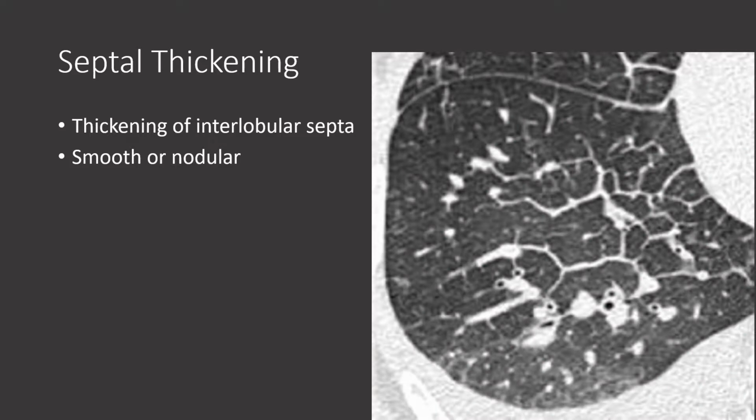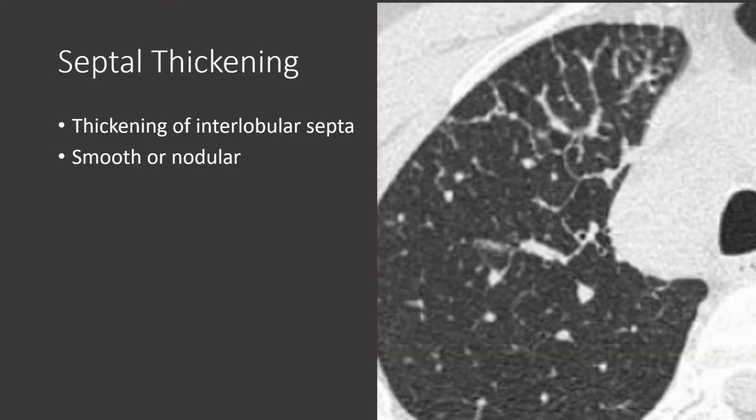Another CT image seen more inferiorly towards the right lung base has a similar appearance, where again we can note smooth septal thickening, these smooth white lines which we can see outlined in purple here in this patient with interstitial pulmonary edema. Again, this is a case of smooth septal thickening. We can see thickening of the secondary pulmonary lobule. In this case, it was due to water. In this patient, we again note septal thickening highlighted in purple.